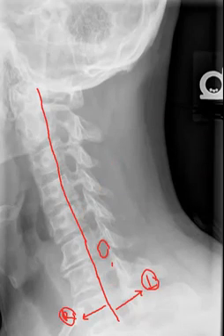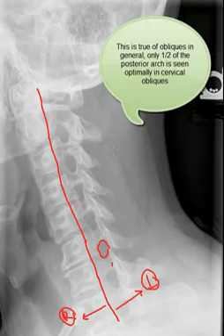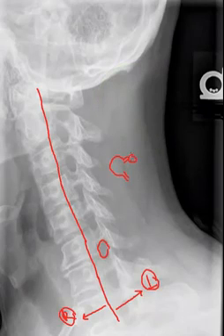All right. So, we've identified the intervertebral foramen, we've identified the pedicles, the left pedicles at least, the left articular pillars, and left facet joints. Now, the left side of the posterior arch is viewed very well, and if I just draw you a little schematic here, this patient is in an oblique position. Here's the body, here's the pedicles, articular pillar, lamina, spinous process. So when we take an oblique projection, let's just say that the X-ray beam is coming from this direction.